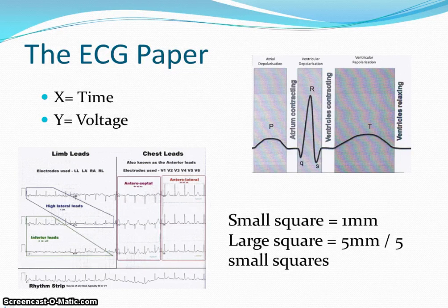On the ECG recording, there will be an isoelectric line. The deflections above and below the isoelectric line represent the depolarization and repolarization of the heart. The classic representation of the full heart cycle is the PQRST wave combination.